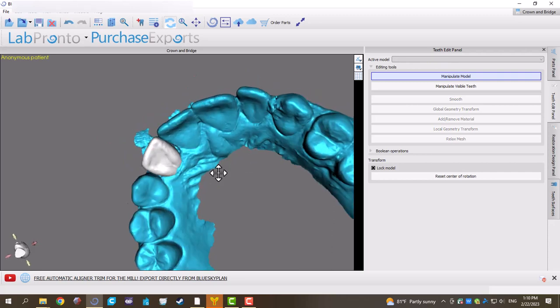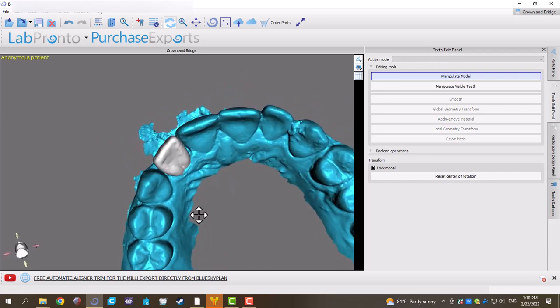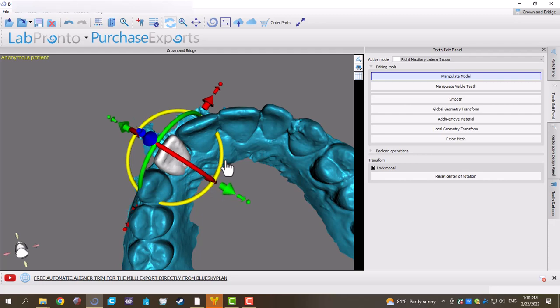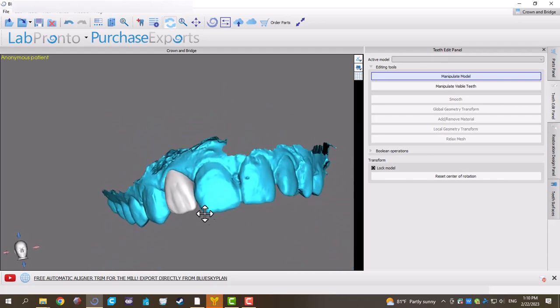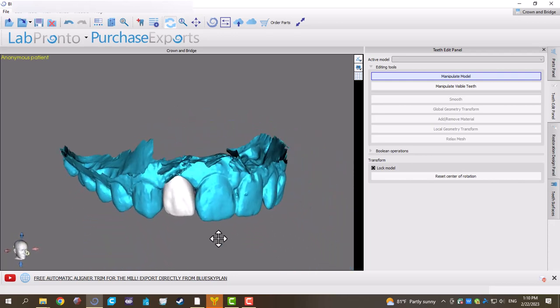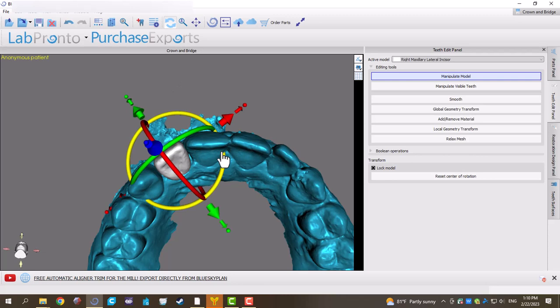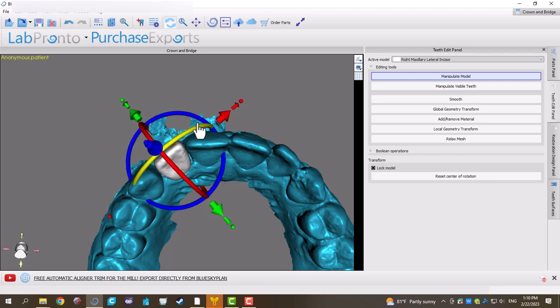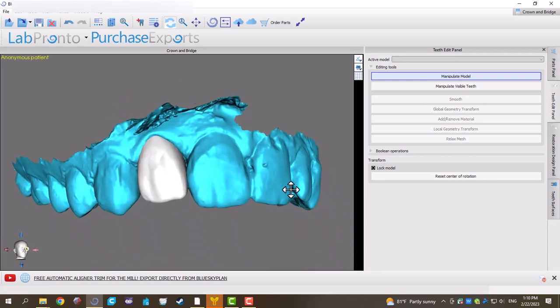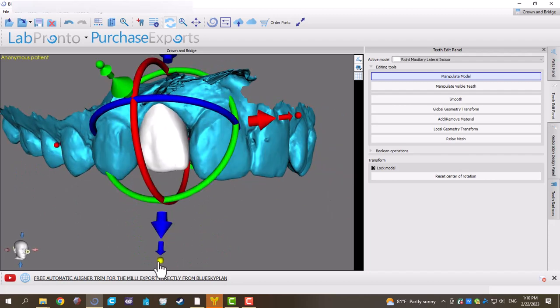Let's try to make number 7 match number 10 a little bit. We can see she needs braces in the future. She's got some pretty bad cavities, so it won't be anytime near in the future. But let's still try to get things as ideal as possible for right now because why not? I'll probably rotate just slightly there because that's probably where the tooth was initially. Perfect. Let's lengthen it a bit here.